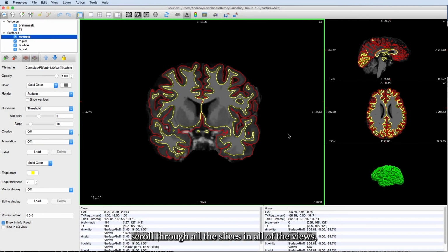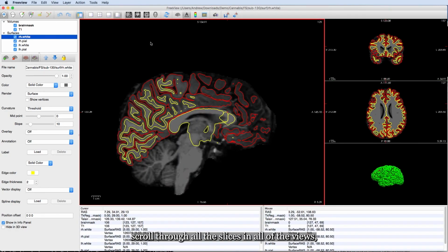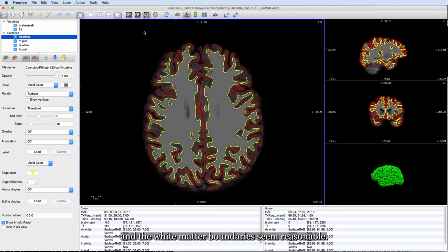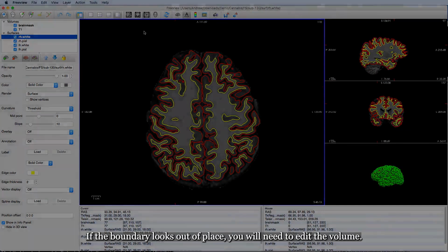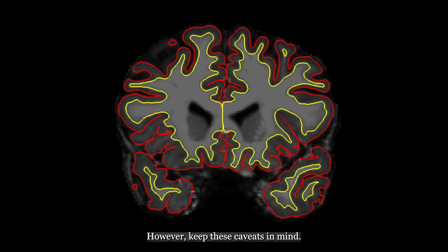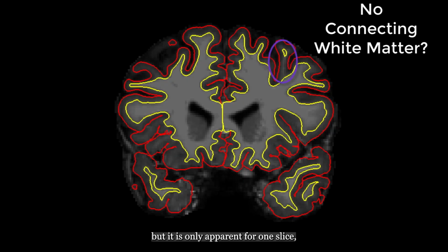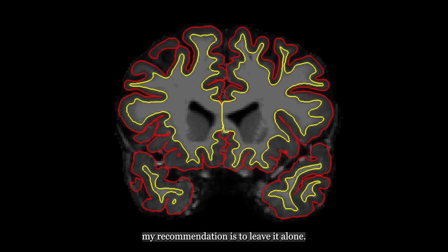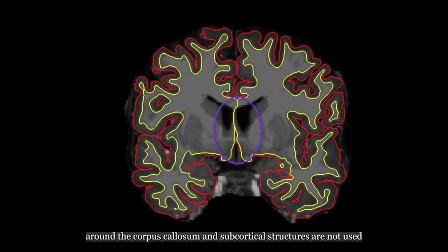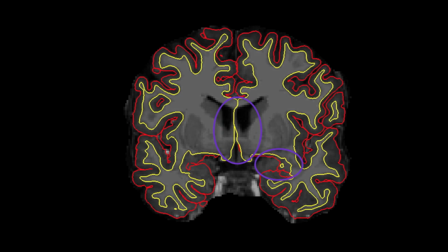Take a few minutes to scroll through all the slices in all of the views, noting whether the outline of the pial surface and the white matter boundaries seem reasonable. If the boundary looks out of place, you will need to edit the volume. However, keep these caveats in mind. If something looks like a misplaced surface boundary, but it is only apparent for one slice, my recommendation is to leave it alone. Also, the surface boundaries along the medial wall around the corpus callosum and subcortical structures are not used in the final surface calculations, so they can be ignored.